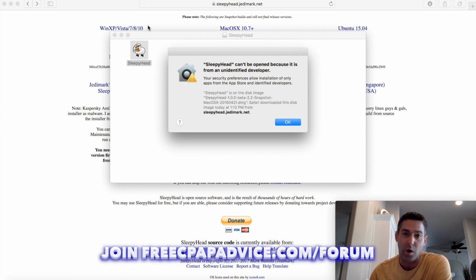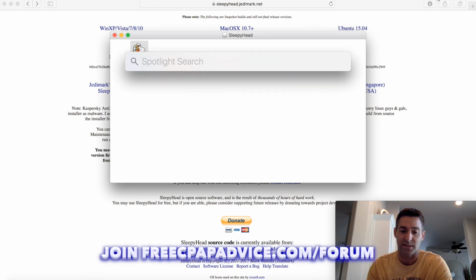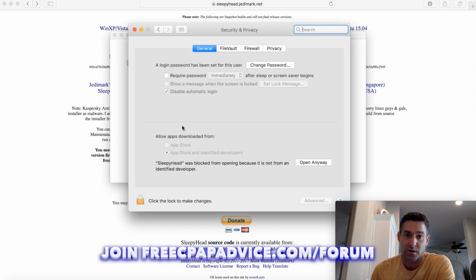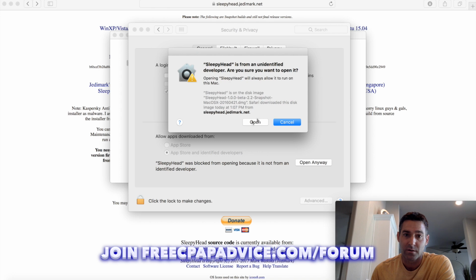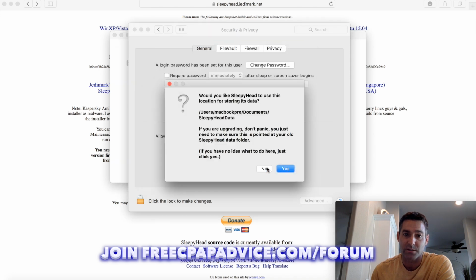So SleepyHead can't be opened because it's from an unidentified developer. Well, we know who it is. Let's go ahead and go into our security settings. And right here, we are under general security privacy. It was blocked. Let's go ahead and open it anyway. Yeah, we're good. There we go. English, US.